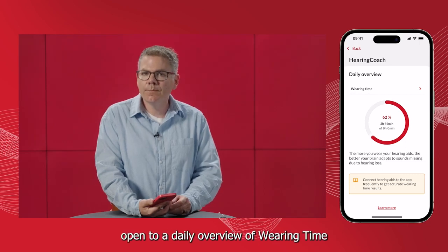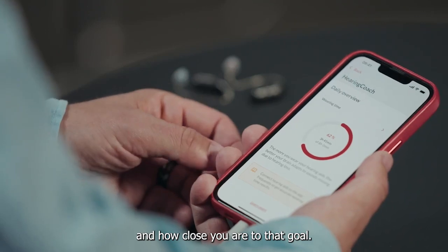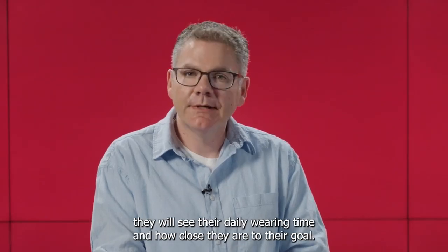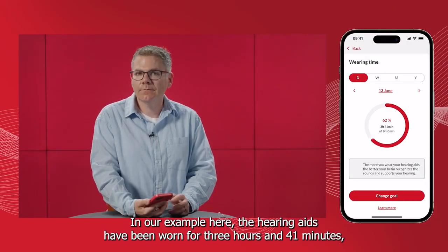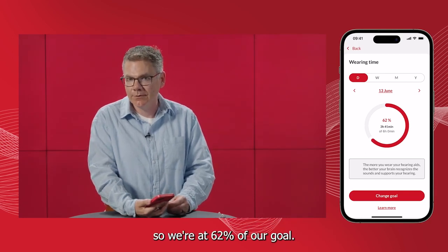Hearing Coach will then open to a daily overview of wearing time and how close you are to that goal. When the user opens up Hearing Coach, they will see their daily wearing time and how close they are to their goal. In our example here, the hearing aids have been worn for 3 hours and 41 minutes. So we're at 62% of our goal.